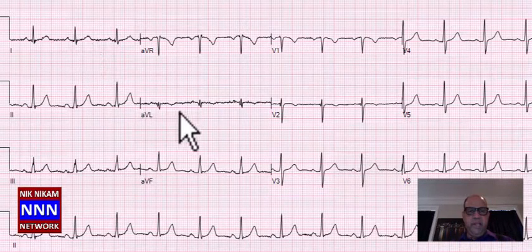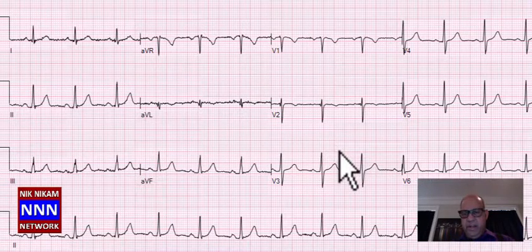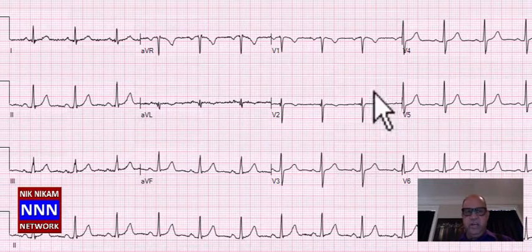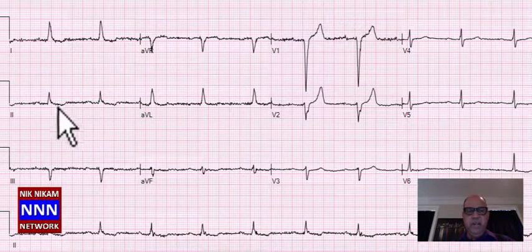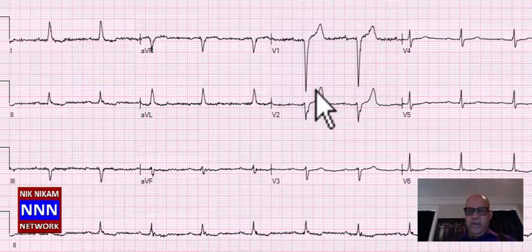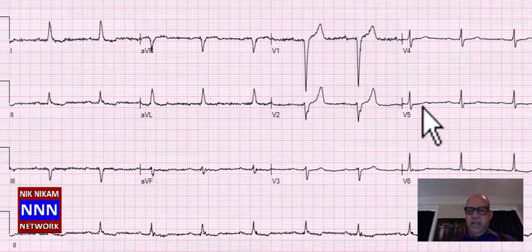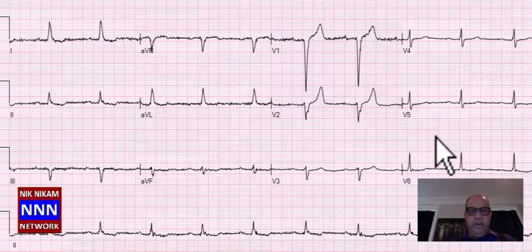Sinus rhythm, high anterior looks okay, inferior leads look all right, anterior leads look all right, and the lateral leads look okay. Pass. Sinus rhythm, flat T waves, right away you can see, and there's a deep Q wave in just one lead, which is sort of isolated. It is not clear as to why we have this one, but nonetheless the STT segments are diffusely flattened. So you wonder what's going on with this patient. So sinus rhythm with STT changes suggestive of ischemia, something like that.